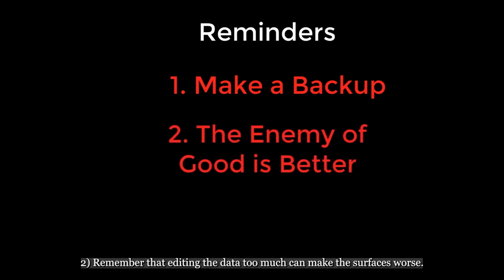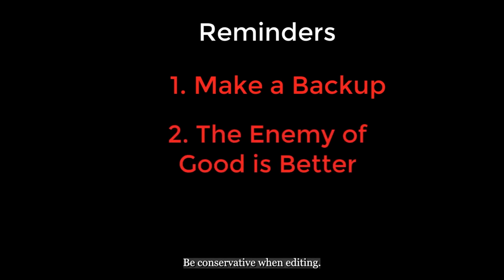2. Remember that editing the data too much can make the surfaces worse. Be conservative when editing. If your data quality is good, Recon-All will be very accurate in creating the cortical surfaces. If you find yourself having to make many edits per subject, this is most likely a problem with your data quality, and it should be fixed at the scanner, not in FreeSurfer.